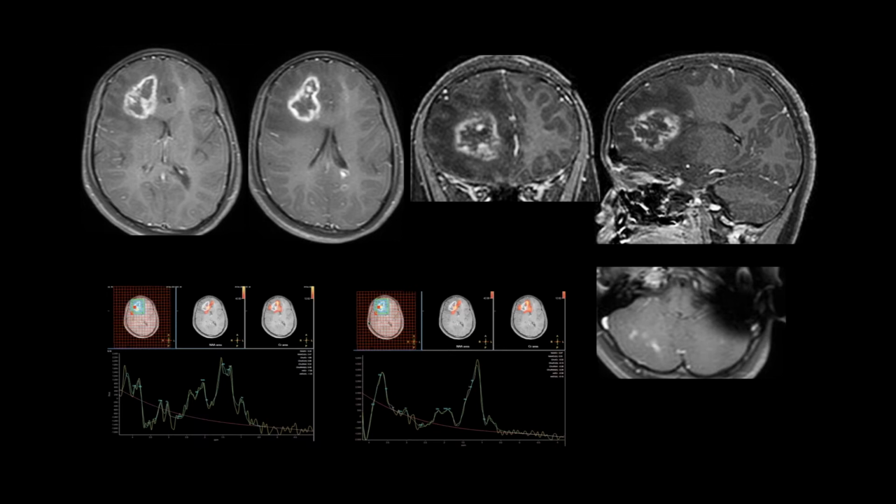The cerebellar lesions seem to be distant anatomically. So, any infiltrative disorders radiologically?